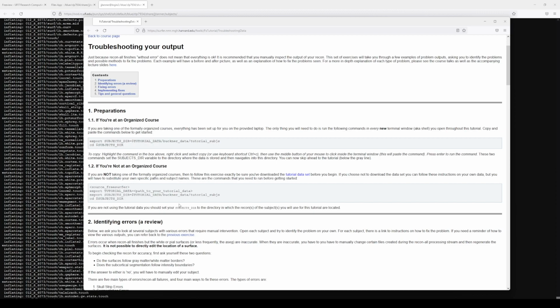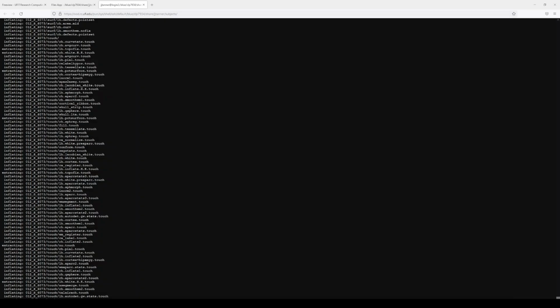Again, subjects directory is a variable that is set by FreeSurfer, so you do have to load FreeSurfer first. And so I will show that. Again, I'm not going to do anything. So I can just do module load FreeSurfer. And in this case, I'm going to use 7.1.1.